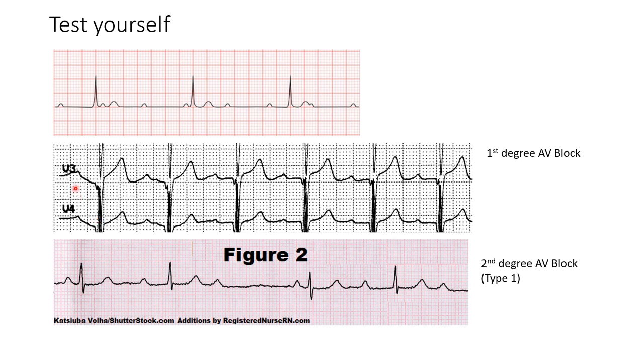Over here we see a PQ interval that is prolonged. I think you can measure it better over here. It's about 1, 2, 3, 4, 5, 6, almost 7-ish small boxes. And we discussed earlier how it has to be around 3 to 5 small boxes long. So this is definitely a prolonged PQ interval.